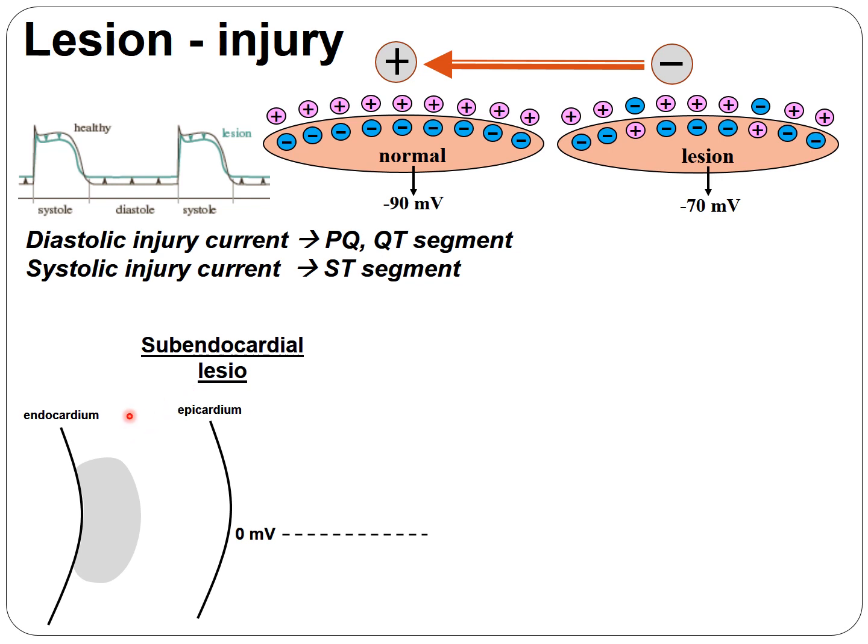When we look at the mildest form of the lesion that involves the endocardium, called subendocardial lesion, the resting potential points toward the surface, toward the epicardium. So the absolute zero baseline is pushed up, and we record a little bit more positive baseline. When the depolarization starts, we have an additional pushing up current that pushes up the tracing.